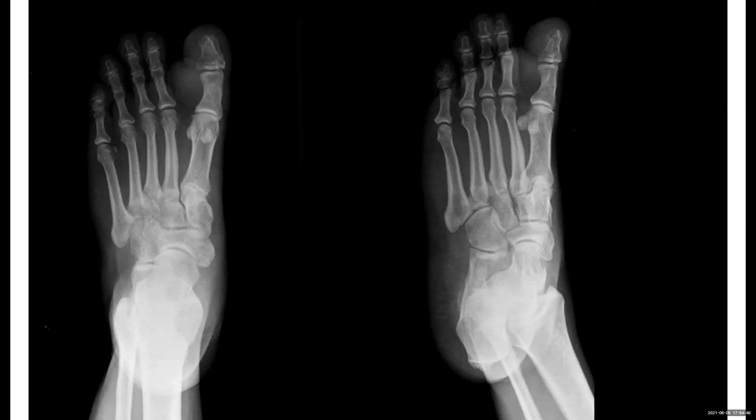However, the patient has a very long-term history. The patient has a long history, ma'am. It is progressing for the last few years. So it can be a soft tissue lesion of benign origin, causing some compression over the proximal phalanx. I'll suggest an MRI to further narrow my differentials. But it is a soft tissue lesion.